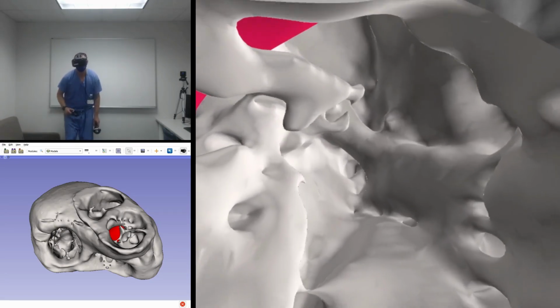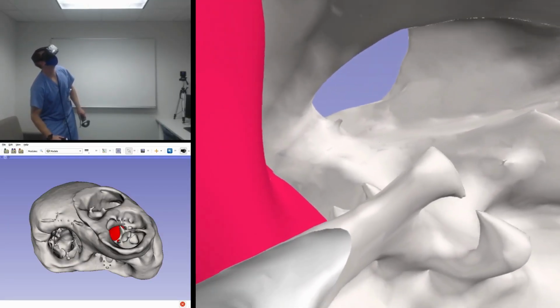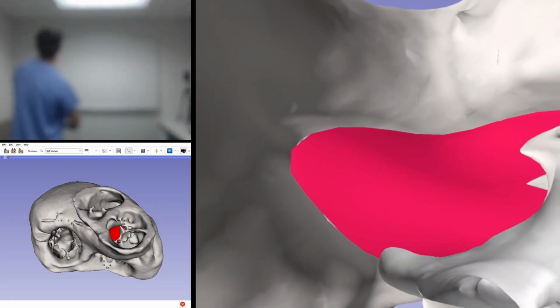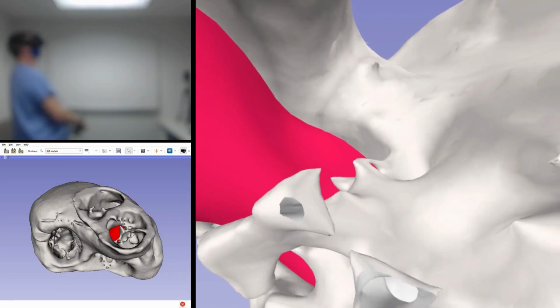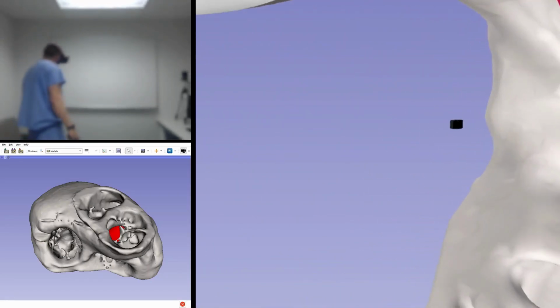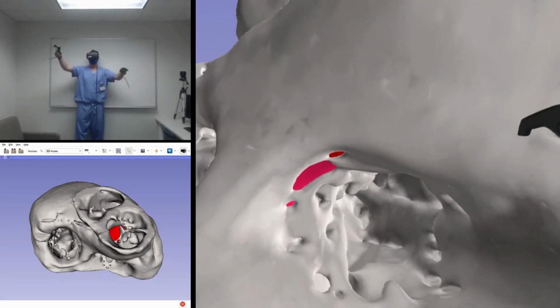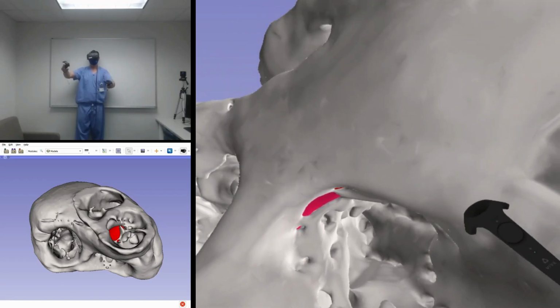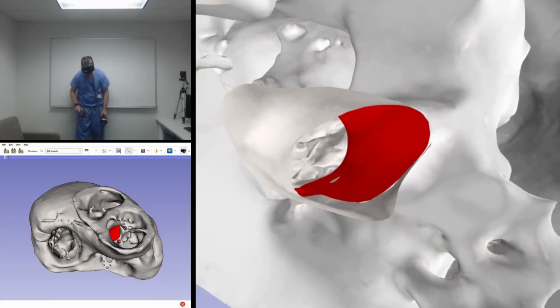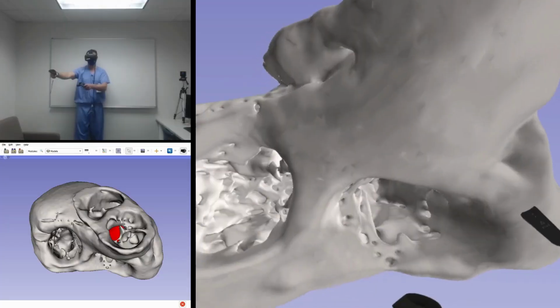We then step into the right ventricle to visualize the baffle from that perspective. Finally, we look down through the aorta at the baffle to provide a third perspective on this potential repair.